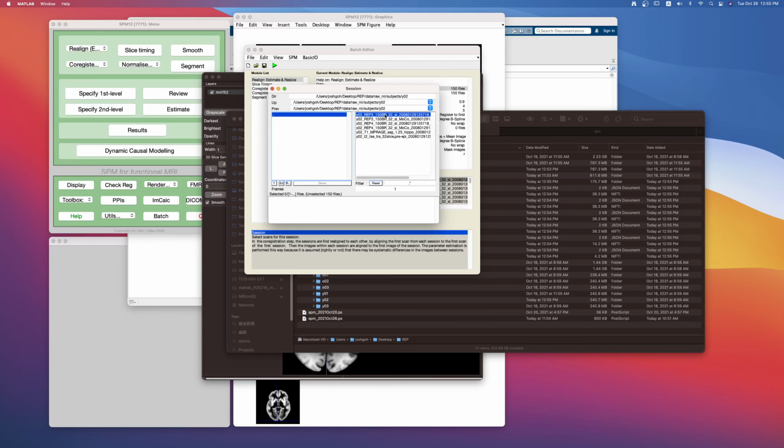And remember, this is motion correction, so I want to do it on the first run and the second run and the originals, not the MoCo motion corrected derived from the Siemens scanner. And you'll note that it's labeled Rep 3 and Rep 4 here. It's not important. It was due to the counterbalancing labeling when we were running the experiment. This is still the run 1 and run 2 for this subject.